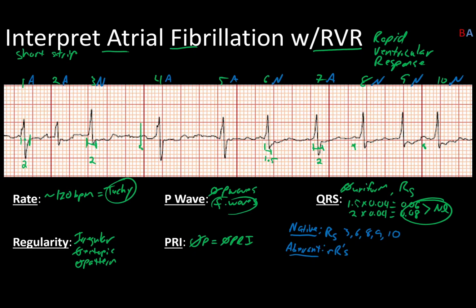Now, granted, number 2 is a little bit different from those because its amplitude is a bit off, but because it's sandwiched so close in between some other ones, I feel like that may be what's causing it. Either way, that's what I'm going to say for that. So we have 1, 2, 4, 5, and 7.